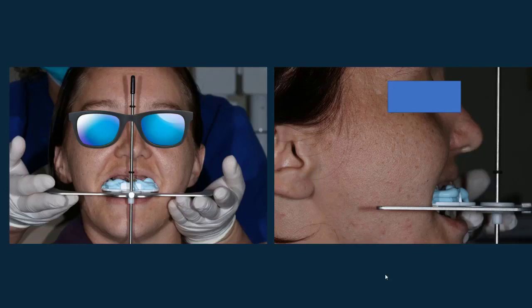And then beyond that, I've digitized all the components of the Panadent articulator as well as the Cois facial analyzer. So I might not ever mount these casts up, but what I can do is I can scan this record and then stitch it in, and now I've got it on a virtual articulator, and I can know all the same information on facial planes and aesthetics and all that.